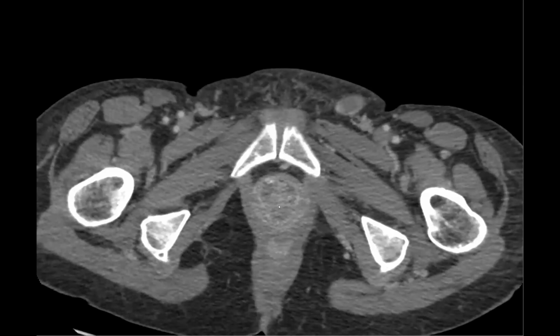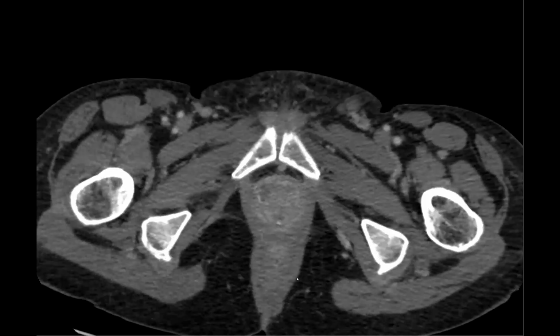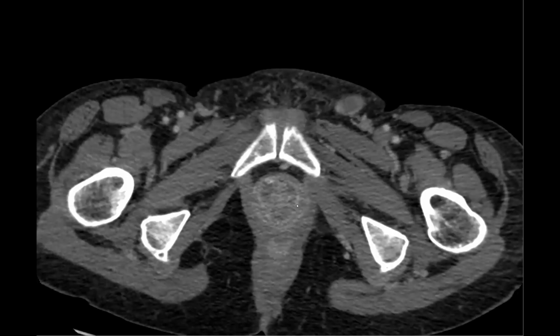It's something else, and it almost looks circular here, right? Like urethra or the vagina. I guess the patient had a GU surgery, so it's probably the urethra. Yes, exactly. Urethral. Actually, malignancy. Was that like a carcinoma arising in a urethral diverticulum? Yeah, it's very horseshoe-looking. Yep, with a node there. I can show you the sagittal.